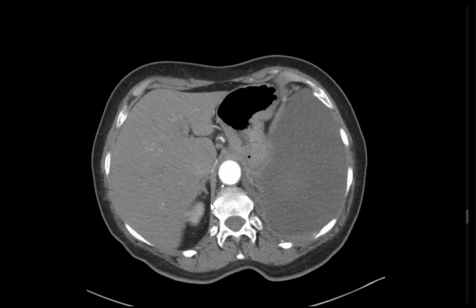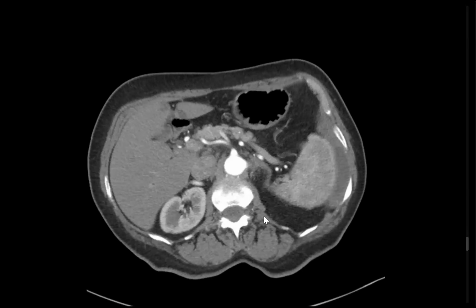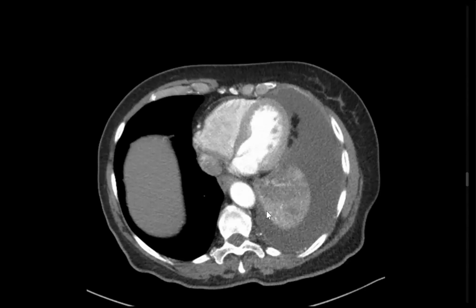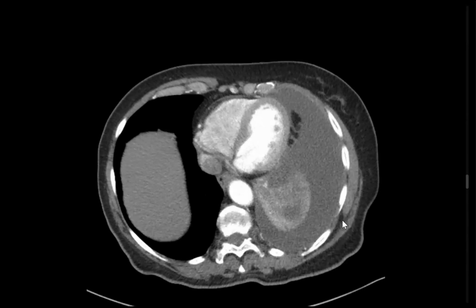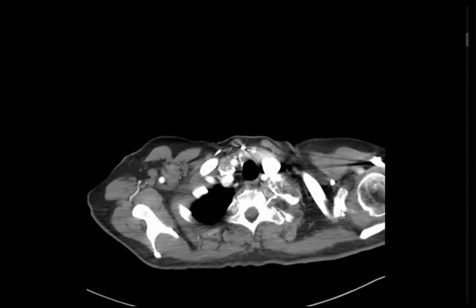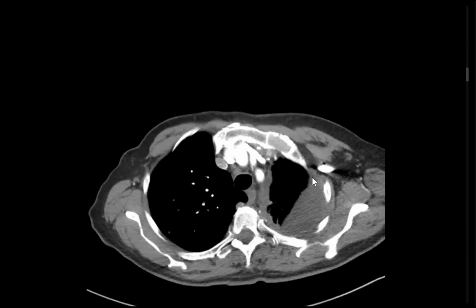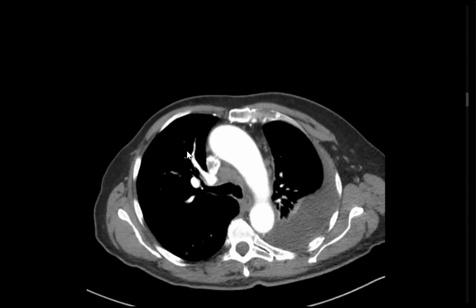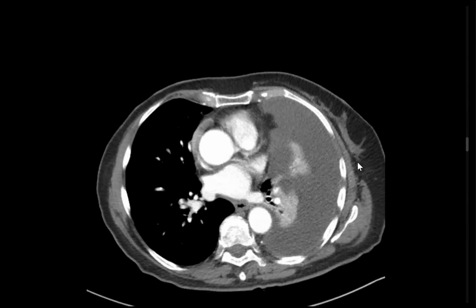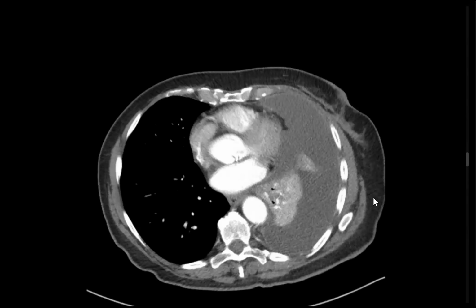Very good. MashaAllah. You commented on breast shadow and you forget the patient has cancer breast. You didn't give me any comment on breast shadow. There is no evidence of adrenal metastasis. The breast shadow on the right side, I'm not seeing, there is evidence of mastectomy. So it's important even in the presence of mastectomy to comment on the operative bed and comment on the other breast. Maybe bilateral breast carcinoma, maybe recurrence in the same site.